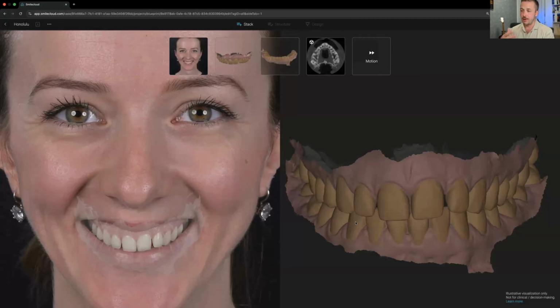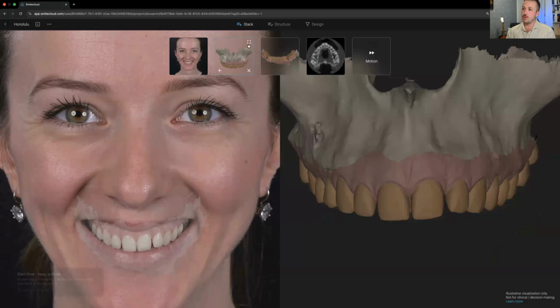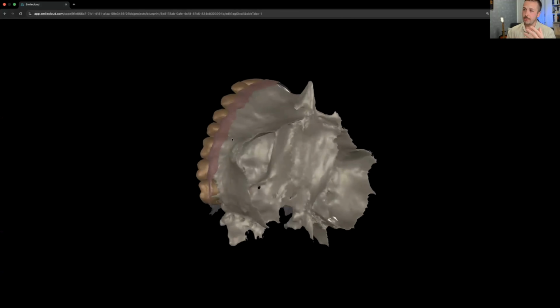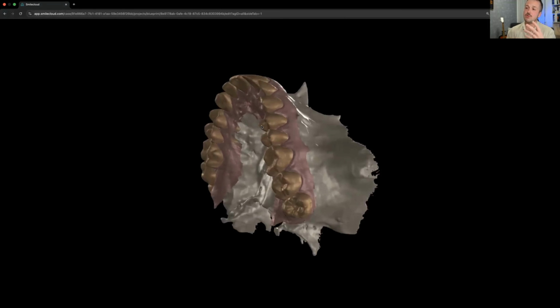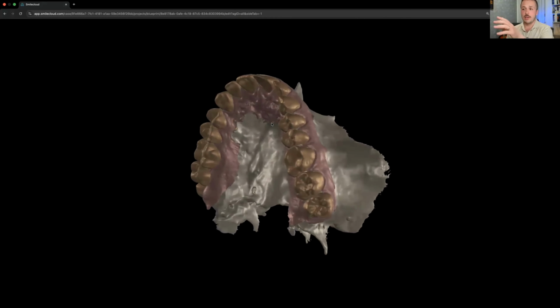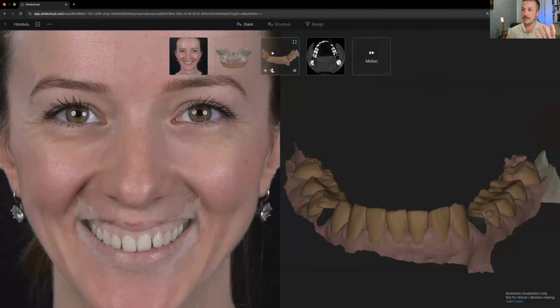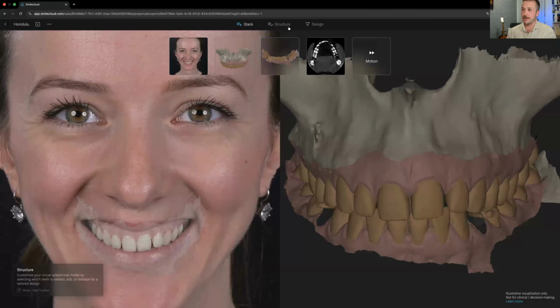Maybe it's not available in your country, or maybe you don't have a business account. But when you get this possibility, it's much more powerful because in this way you get control of the layers of the patient. And it actually didn't take long. It did all of the segmentation in, let's say, 20 seconds while I was just talking about something.